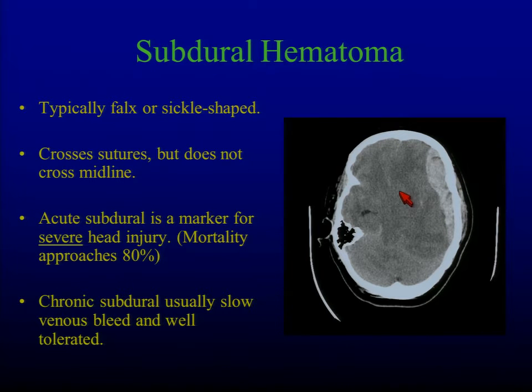If you look at this brain, here's the right lateral ventricle. There's no left lateral ventricle. If you look at the density here, it's a homogeneous mess. This brain is unhappy. There's no cortical gray-white differentiation. There's midline shift, and that's not coming from this blood collection. You remember that huge epidural we just saw. Half that kid's brain was blood, but it didn't have unhappy brain.